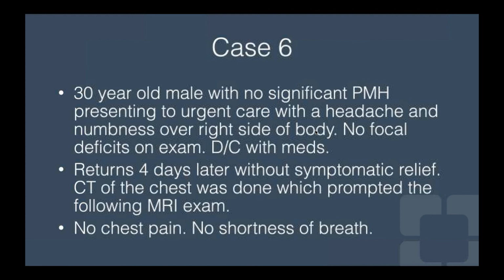Basically, what we see here is that the ostium of the left pulmonary artery originates superior to the right pulmonary artery and to its right, so it kind of crosses over, it saddles it, like we said. And that is that case.